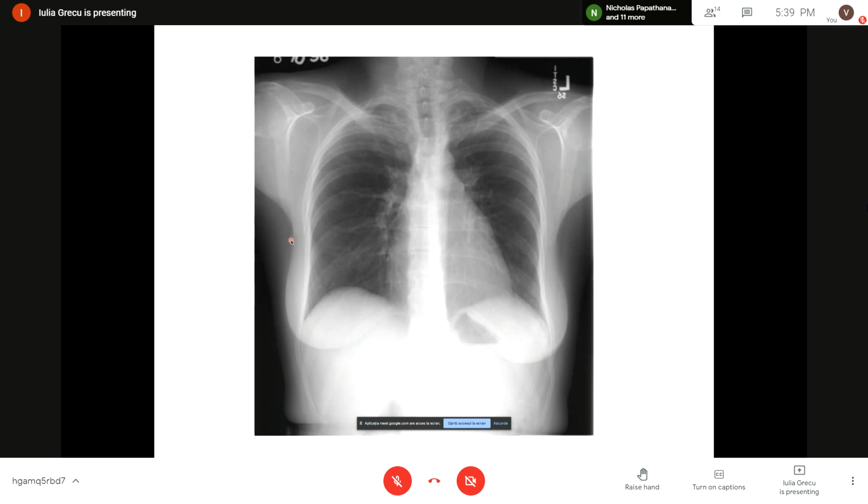The other areas of soft tissues that we can see on the chest film are the laterothoracic soft tissues, composed of skin and the fat that lies immediately under the skin, and the axilla area, where we can sometimes find lymph node opacities.